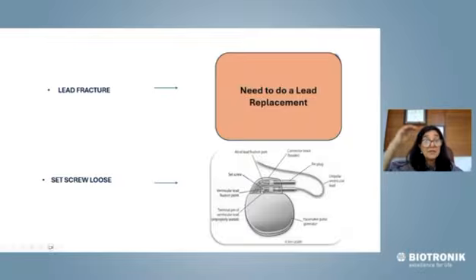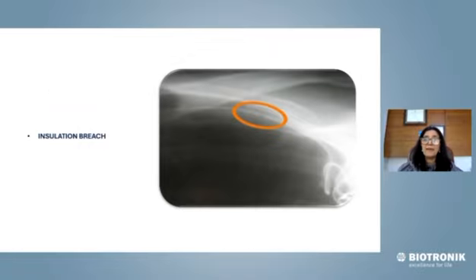So remember, this typically will happen in an acute setting. And what will happen to the impedance? Impedance will be high because the circuit is not complete. So remember, these are certain features which you should be very well aware of to identify.